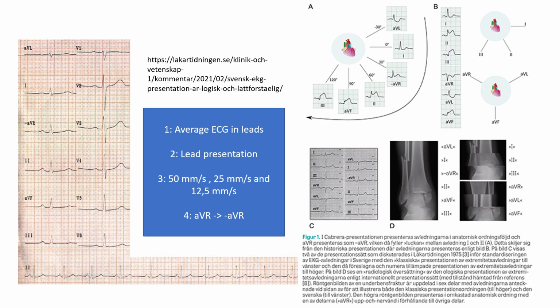Then you have the lead. Sorry, I'll jump to this one first. Then you have that this up here always looks so wide to me, and that's because this is in 50 and not in 25. 25 millimeters per second down here, 50 all the way up here. And some of the ECGs also have 12.5, as I'll show in the next slide.